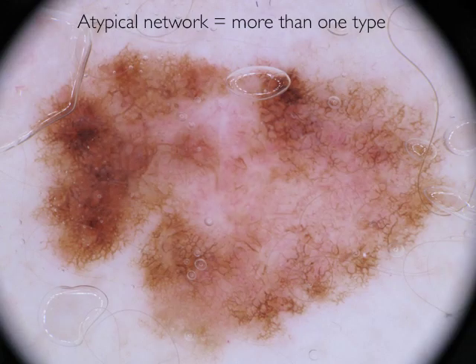This is an example of melanoma in situ showing clear-cut atypical pigment network. The definition we use is that more than one type of network in the same lesion means that this could be an atypical network. And here we can easily see that we have a prominent dark brown network on the left side and a delicate light brown network on the right side.